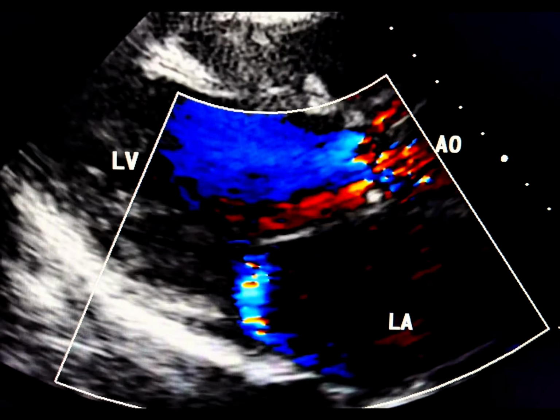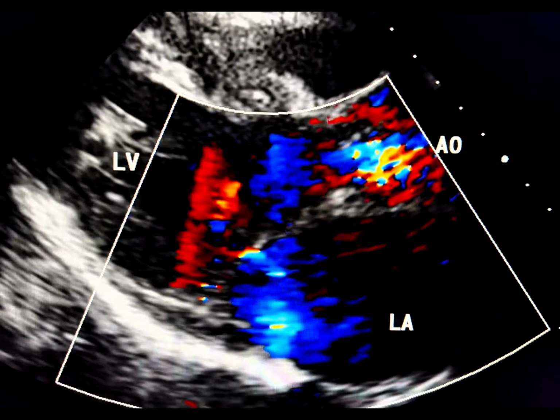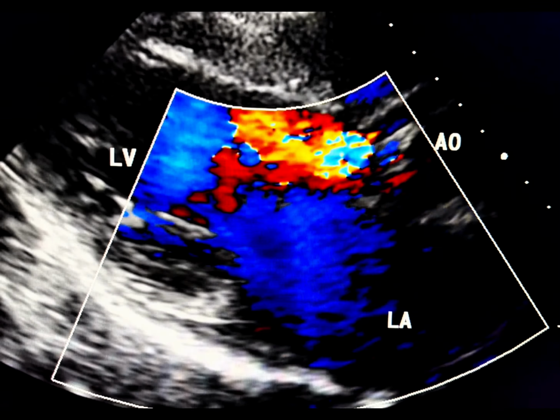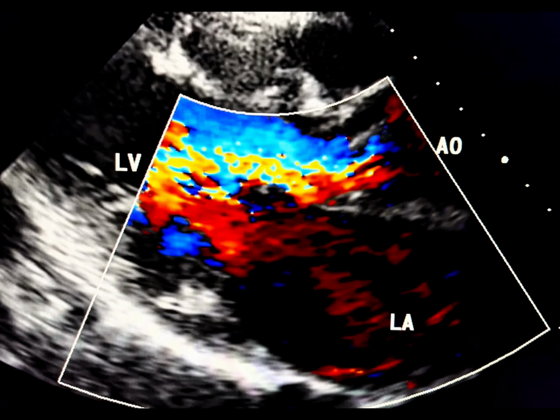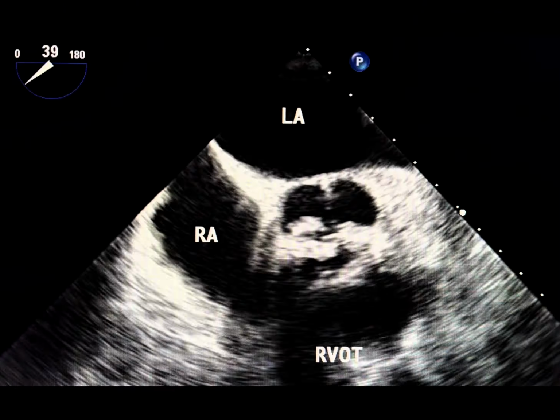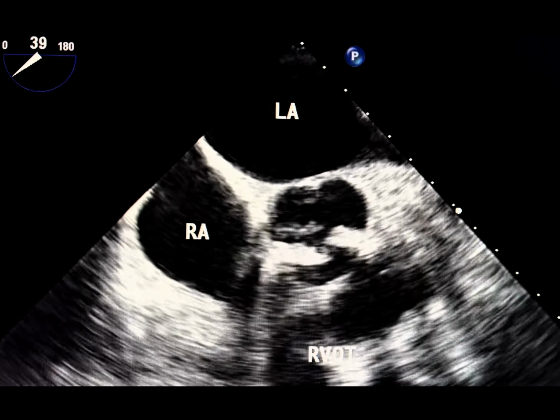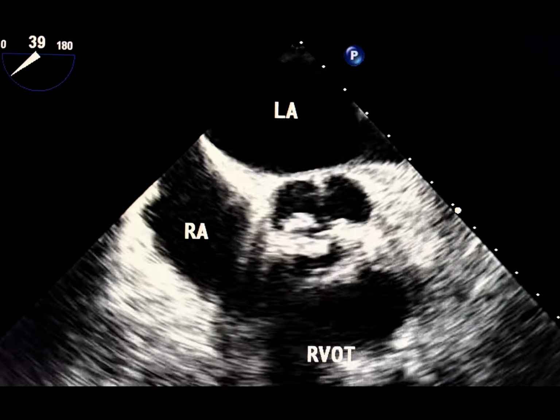Look at this view. Severe aortic insufficiency (AI) is illustrated, but it's crucial to determine the etiology of AI as well as its severity. This short-axis view of the aortic valve shows thickening and calcification at the tips of the aortic cusps. This feature suggests rheumatic involvement.